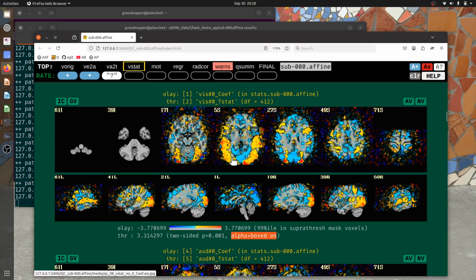So everything is opaque with a little line around it, which is easier to see than up above, even though the same kind of thing was on. Where we are above threshold, things below threshold fade away as the statistics get smaller and smaller. This is a block design. There's a large, strong response. Again, there's an audio and visual component to it in both cases for our stimulus.